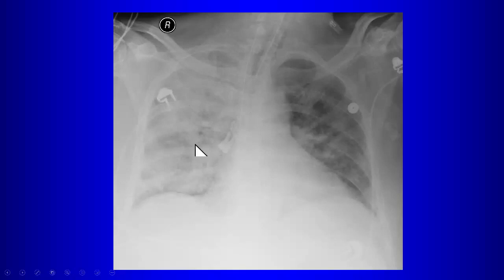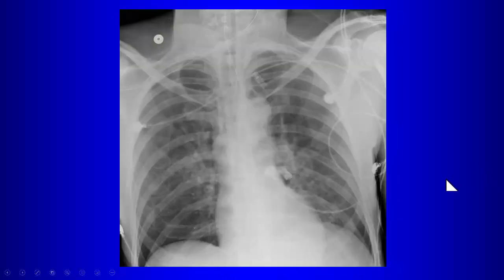It's easy to overlook this because you see all of these markers that we normally just dismiss, but here there's a glaring abnormality that explains the larger abnormality on the chest radiograph. Now, having seen that, you should have no problem with this chest x-ray. What do you see here? Yeah, there's a tooth in the left main bronchus, right?